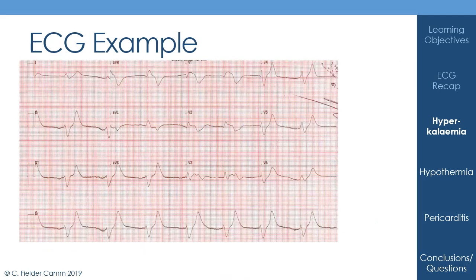Okay, so here's an example ECG. Feel free to go through it in your own time, pause the lecture, and then we'll go through it together in a second.